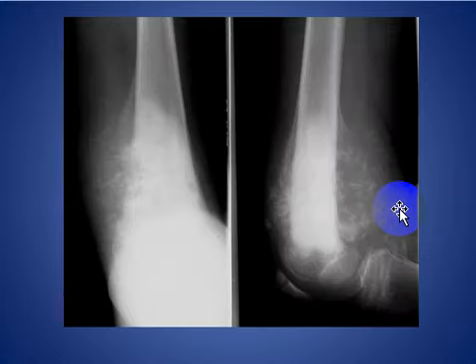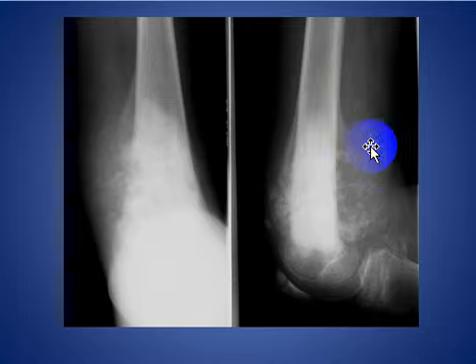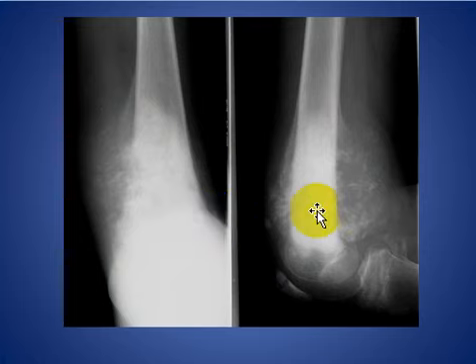Here the child patient, as we see the epiphysis here, and we see patient with aggressive bone lesion with some periosteal reaction and soft tissue swelling with destruction of the metadiaphysis of the distal femur consistent with osteosarcoma.